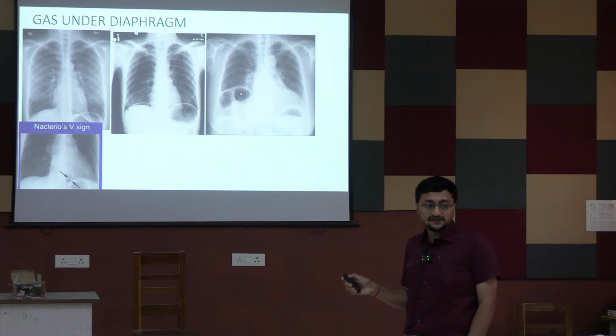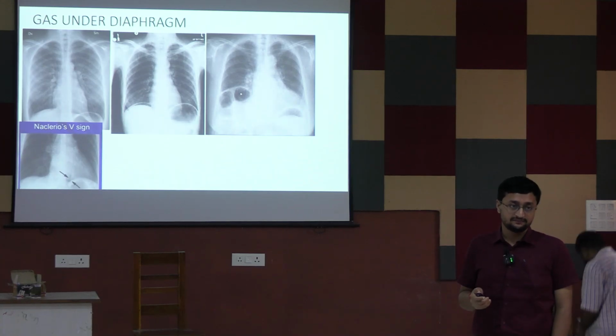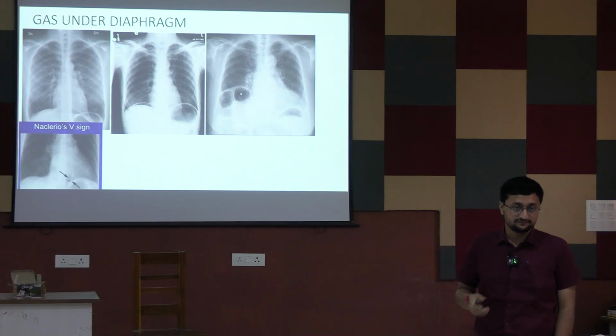Clear? So this is a sign of, any idea? Pneumomediastinum. That means air is trapped inside the mediastinum.